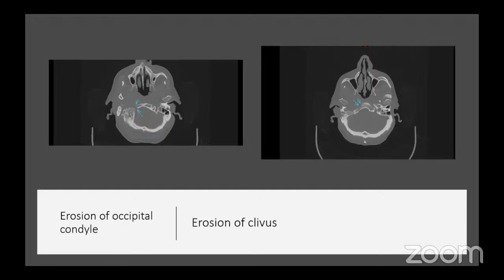This is all suggestive of skull-base osteomyelitis. This patient was treated with long-term IV antibiotics. The patient recovered slowly.